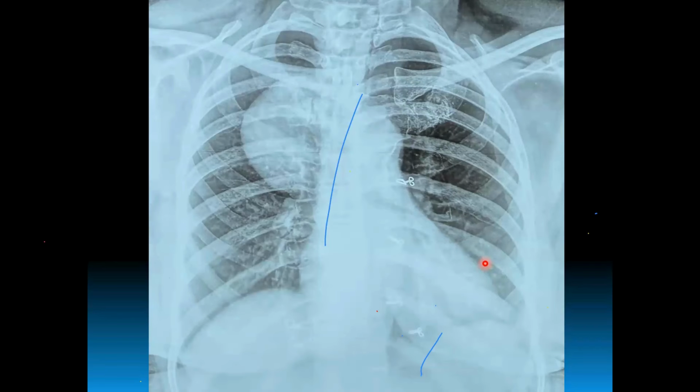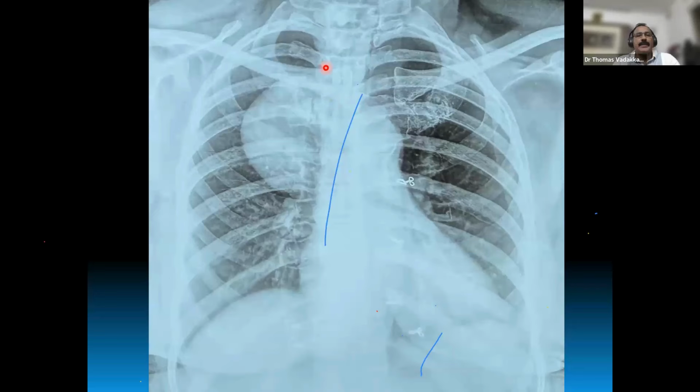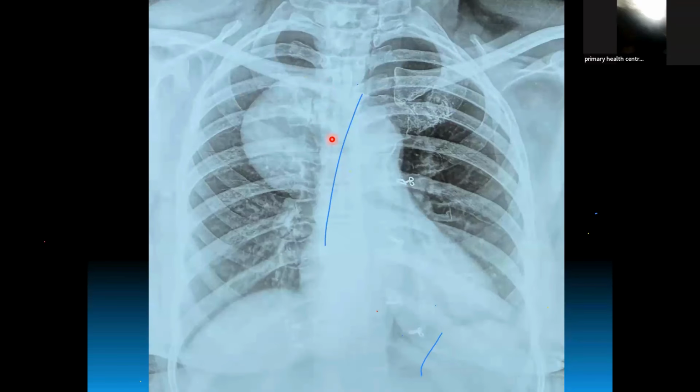Thymoma. Yeah, we can say that there is a mediastinal mass in the right paratracheal area. Differential diagnosis most common is retrosternal thyroid, thymoma, but usually thyroid will have a continuity with the neck mass. There is not there, so thymoma should be the first one, or maybe a large lymph node, maybe teratoma. So all these comes as differential diagnosis. Sometimes mediastinal cyst can also present like this.